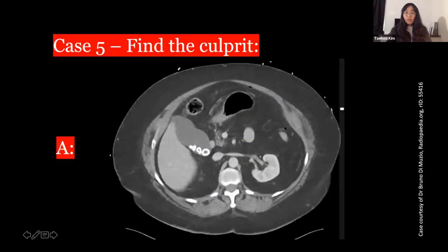Now, here I'm going to be showing you 3 slices of CT of the same patient who comes with abdominal pain. I need you to find what could be causing the patient's pain, okay? So this is the upper abdomen where it shows the liver, gallbladder containing something. It shows some part of the stomach, left kidney. So take a look at this.